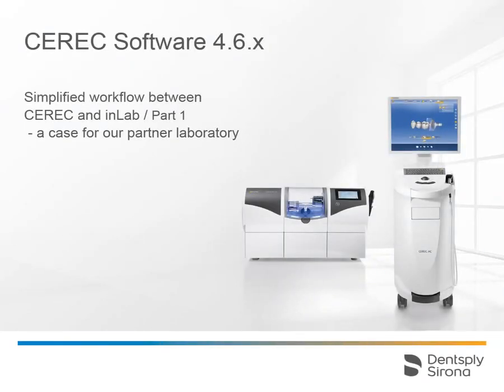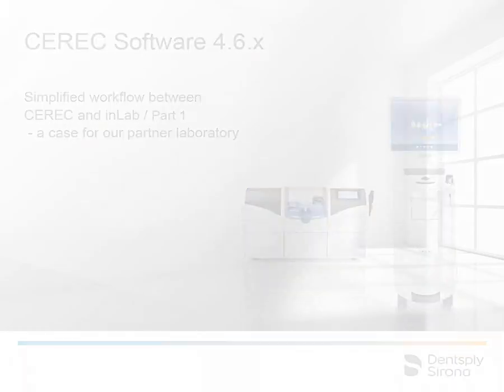Welcome to this video tutorial on the topic of simplified workflow between CEREC and inLab. In this video, we demonstrate the workflow in the CEREC 4.6 software up to the simplified transfer of the data to our partner laboratory in a case involving 5 lower jaw anterior crowns.